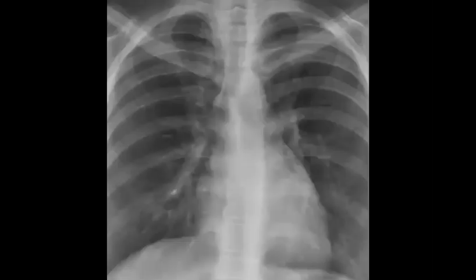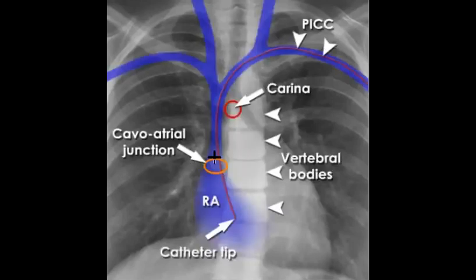And what about here? Is it good or bad? The PICC. So this is the peripherally inserted central catheter. And we mentioned that the long-term catheters should be inserted in the cavo-atrial junction. So the target will be here, but he introduced it to the level of the right atrium. So the PICC, yeah, it's going well here, but he introduced it too far, so it is not good.